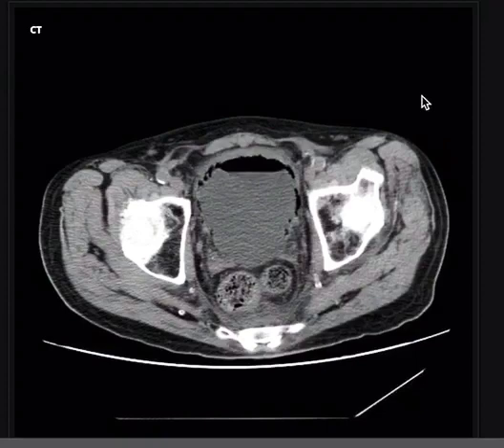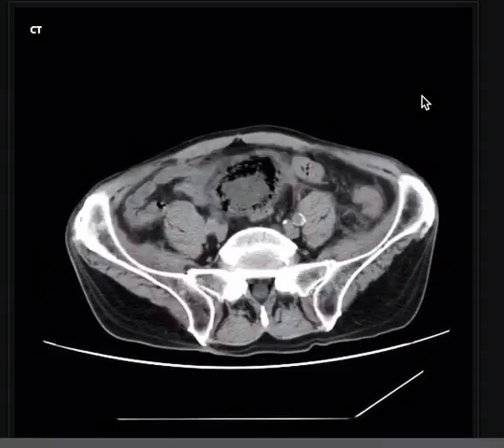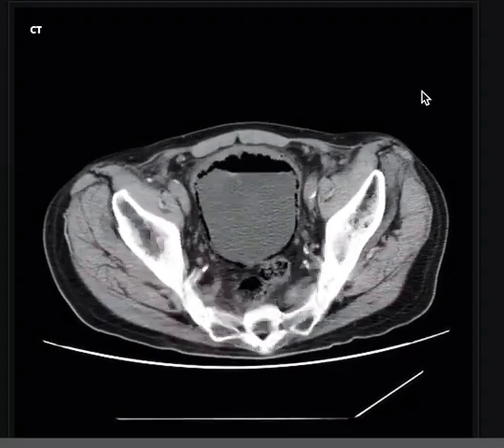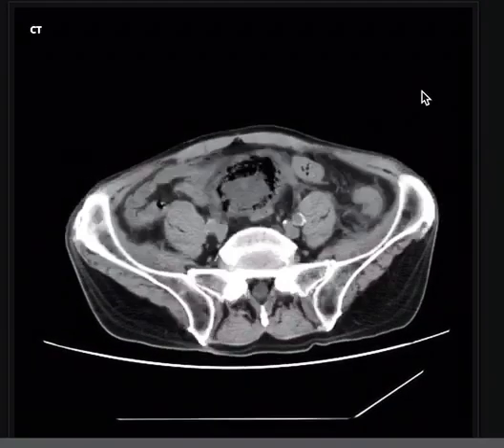This case was taken from Radiopaedia just for education, and the CT of the abdomen was not completed, but this is an important point to search for in cases of emphysematous cystitis: to exclude associated emphysematous pyelonephritis.